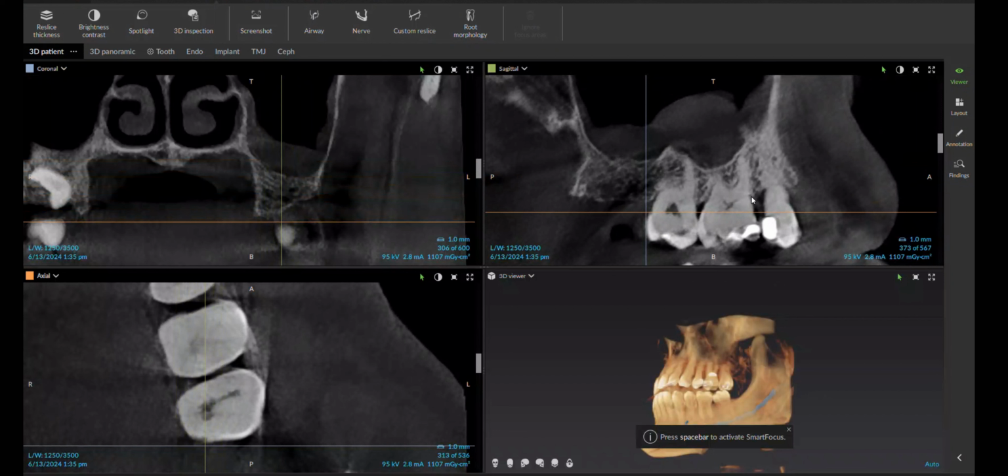So I'm looking at right here. With that said, I'll make note of that. I also see the same thing here. The odds of having both of those present in two different teeth, 1 in a million situation, which would more or less cause me to move on.